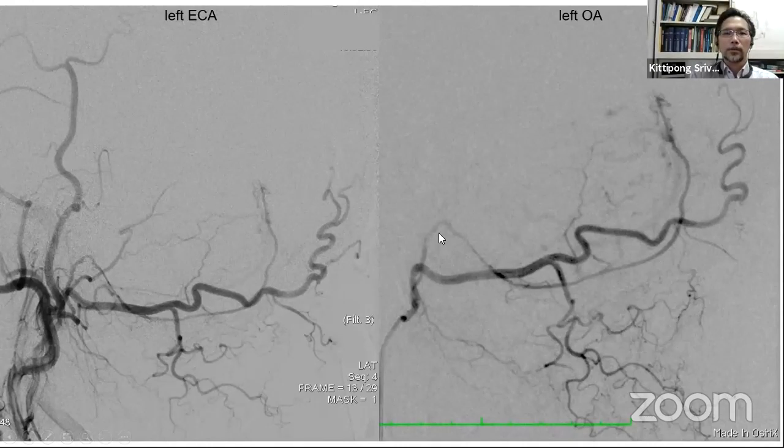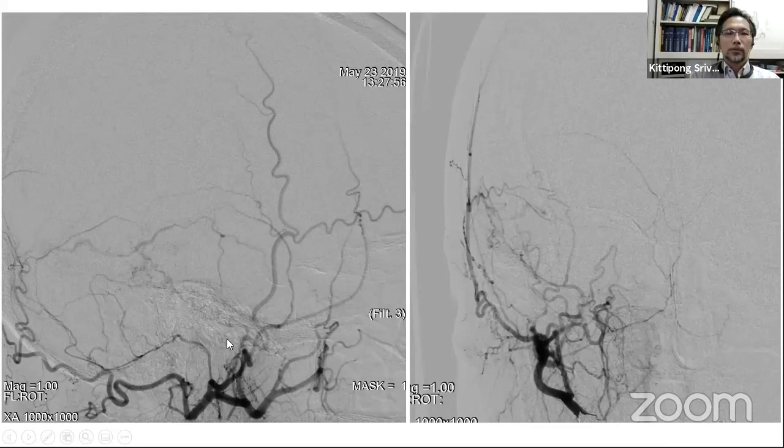So it has this particular shape that you can always recognize. This is another example. Okay, so this one you can see here, over here on the anterior posterior view. It's quite difficult to see, but at the end you see the dural branches of the posterior fossa over here from actually this artery.